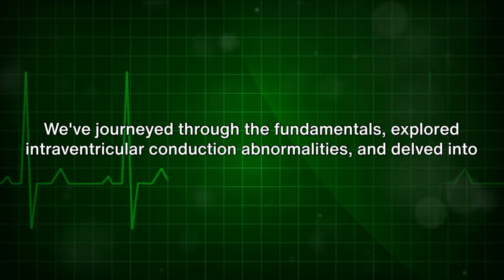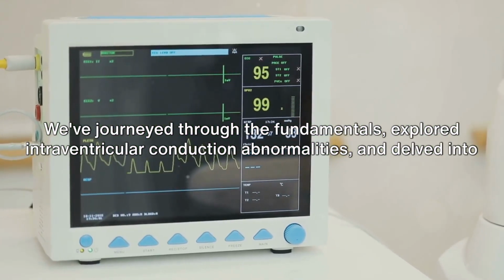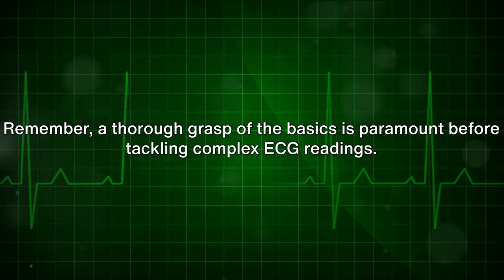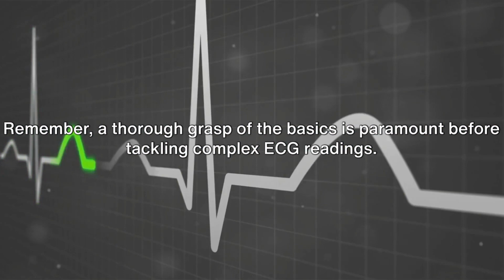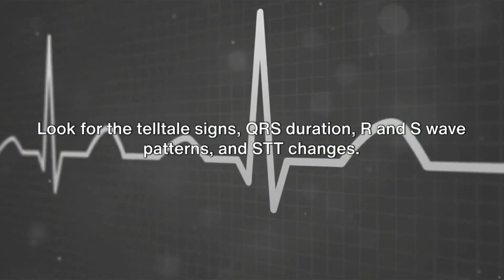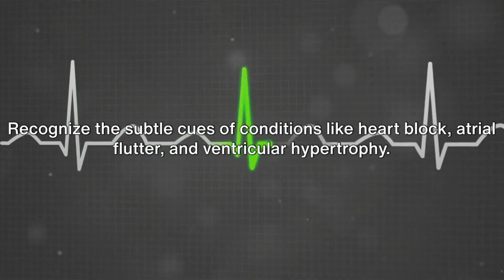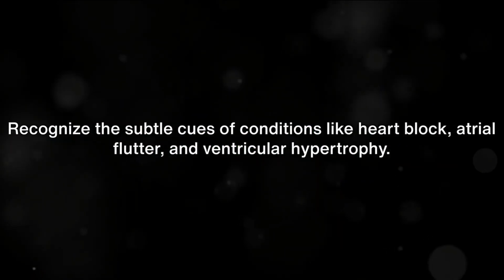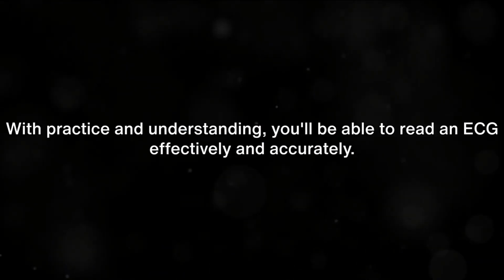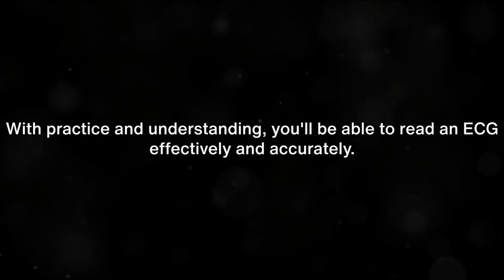We've journeyed through the fundamentals, explored intraventricular conduction abnormalities, and delved into fascicular and bifascicular blocks. Remember, a thorough grasp of the basics is paramount before tackling complex ECG readings. Look for the telltale signs: QRS duration, R and S wave patterns, and ST-T changes. Recognize the subtle cues of conditions like heart block, atrial flutter, and ventricular hypertrophy. With practice and understanding, you'll be able to read an ECG effectively and accurately.